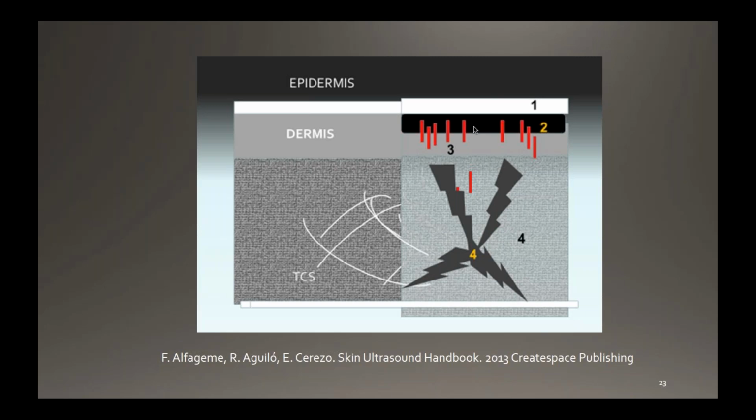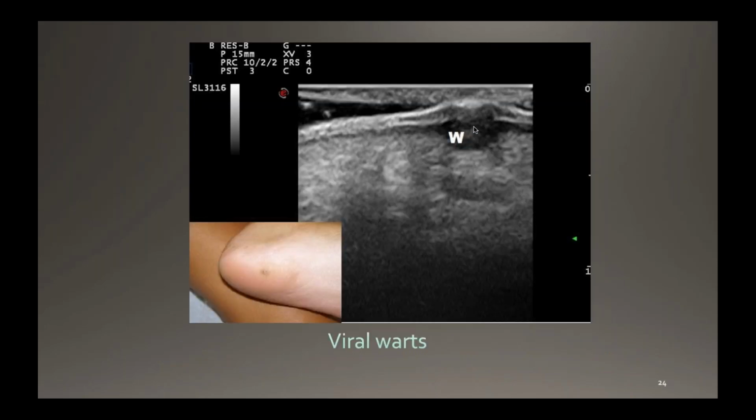And in the subcutaneous tissue, you will see that instead of the hyperechoic septa that are usual in this area, you will have those hypoechoic septa that are a hallmark of panniculitis, of inflammation of the septa of the panniculus, together with the more echogenicity of the fatty cells that is reflected by hyperechogenicity of the subcutaneous tissue.